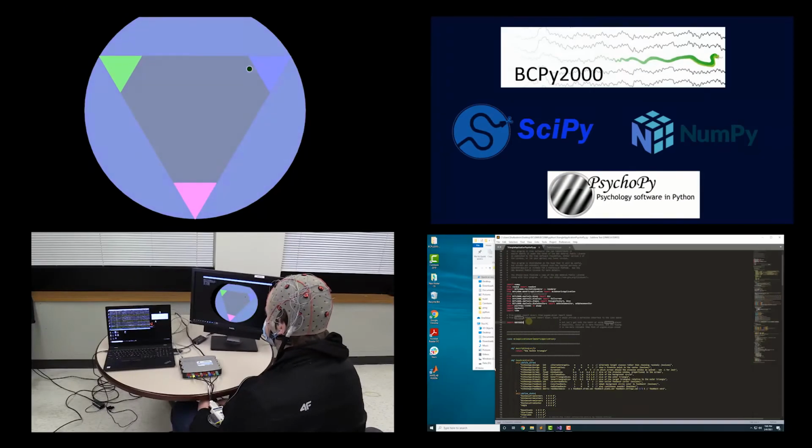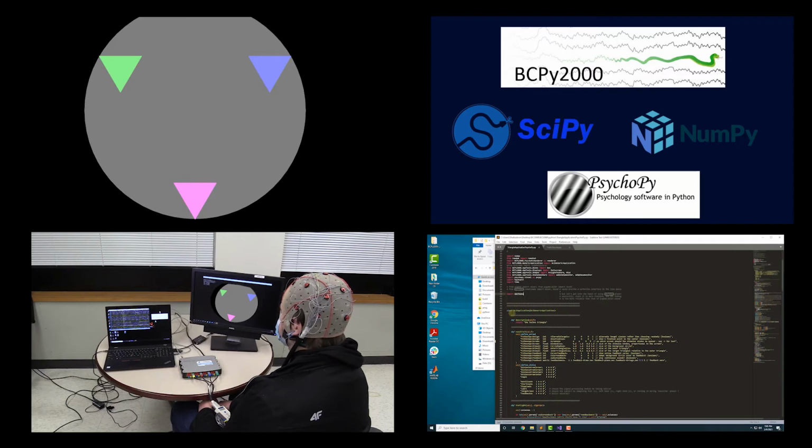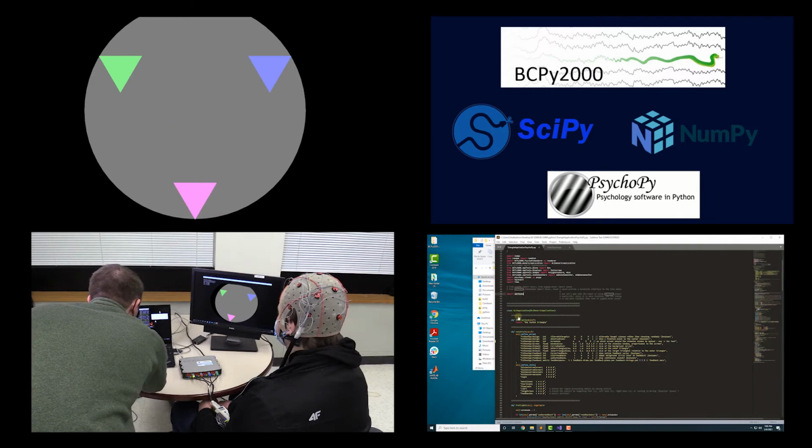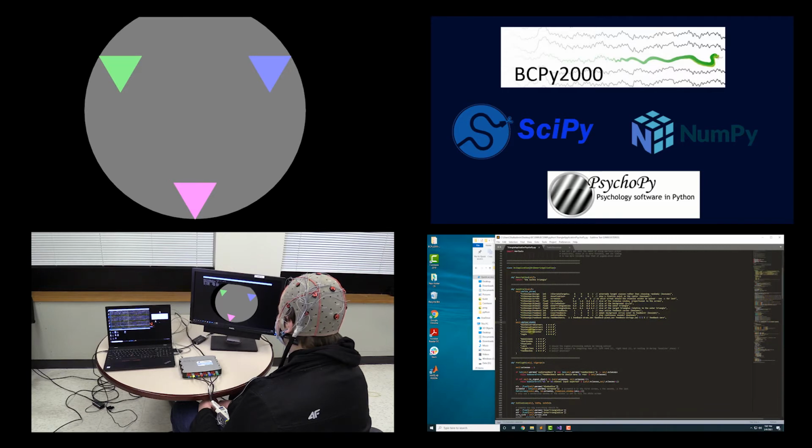Welcome to the BCPy2000 demonstration, now updated for Python 3.6, featuring a completely new open source flexible real-time visual stimulation module, PsychoPy. In this video we will first go over what BCPy2000 is, why you may want to use it, an in-depth installation process, a demonstration of our Triangle app boasting a wide range of features, and a tutorial on how you can create your own PsychoPy experiments within BCPy2000.